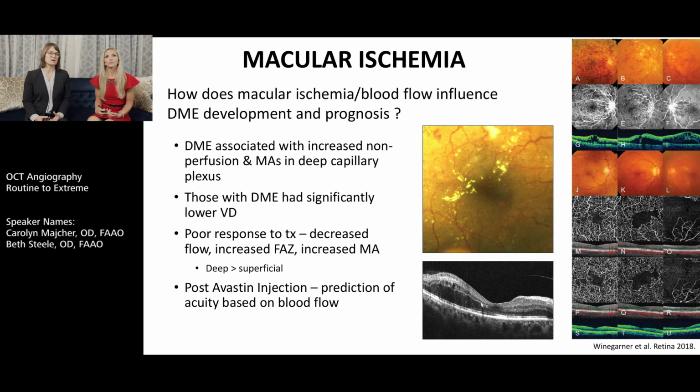And that's really useful for the retinal consultant, and it's also useful for them to determine need for retreatment following that condition over time. We can treat macular edema, but we can't treat macular ischemia at this time. And so if I see a patient that has both going on, I know I can treat the edema component, but I'm going to educate that patient that there's a guarded prognosis because there's a lot of ischemia there. We might not hit like a perfect 20/20 acuity after treatment. We're probably looking at something more like 20/40. And that takes some clinical experience, I think, knowing how much macular ischemia there is and what visual acuity that correlates with.